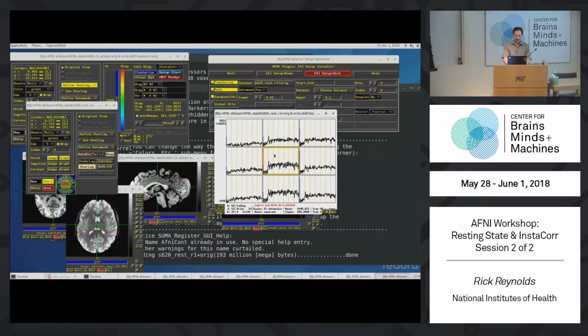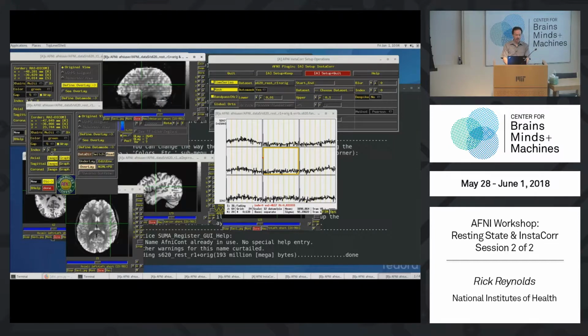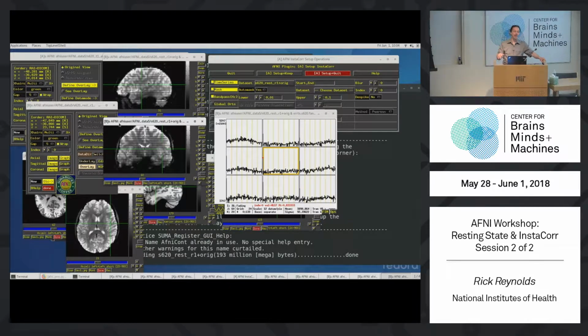If you look at the graph window, let me get out of the mid-sagittal plane. You notice, I don't know if you can see, but the red dot at the beginning of the time series, all the way at the left, is way high up. So we have pre-steady state data here. If you look in the orthogonal views, the coronal or sagittal views, you can see the striping. This striping, I guess I'll mention briefly, is similar to a motion stripe.